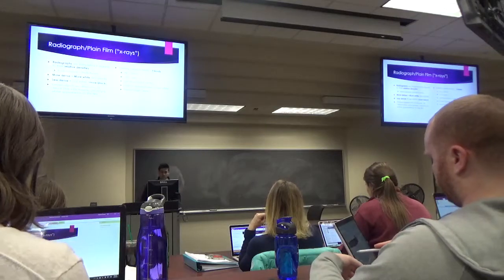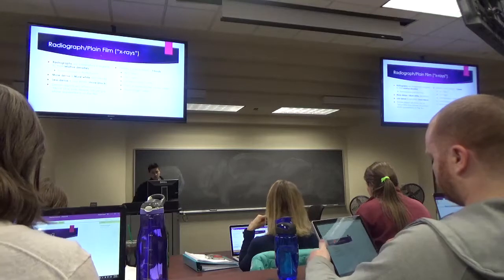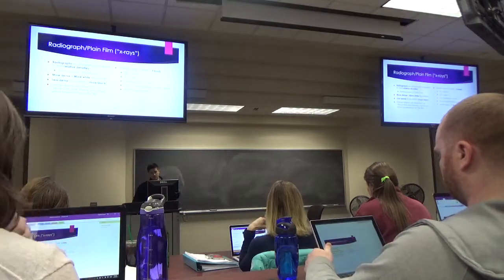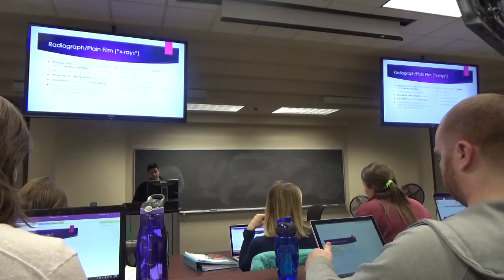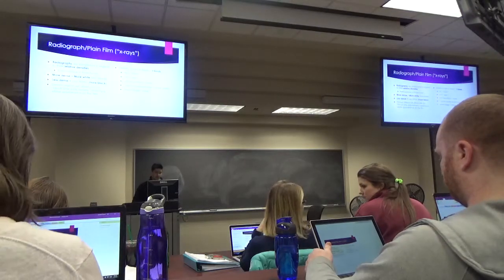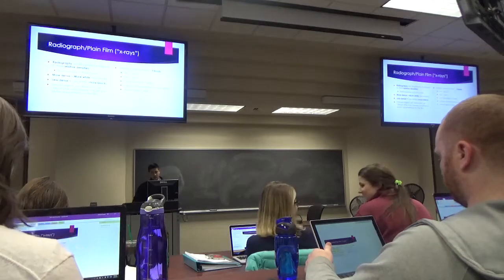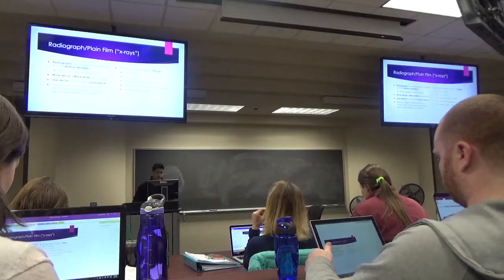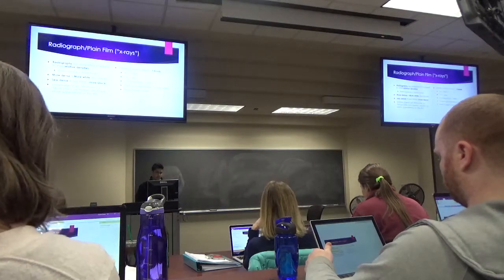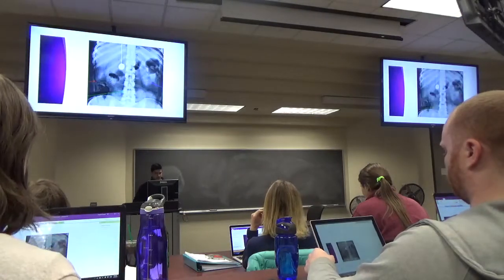So with X-rays, you're limited to 5 different densities that we can distinguish. Going from least to most dense, the most black is going to be air. The most white is actually going to be metallic artifacts, foreign bodies, pacemakers, things like that. So you can see here air, fat, soft tissue, calcium, and metal. If you keep these in mind, it'll help you a lot in determining exactly what you're looking at. So these are the 5 different densities out there.